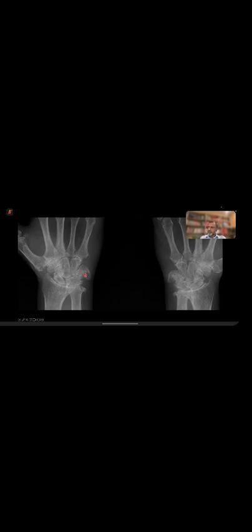Again, same thing, magnified view, prominent erosions. So we do ultrasound, that's how you see erosion. You can see the normal outline of the bone here, and this is the defect on the top. However, there's a normal pit on the top as well, but that is smooth, at the head and neck junction, whereas this is irregular because you can see the synovium going into it, and there is some vascularity as well.